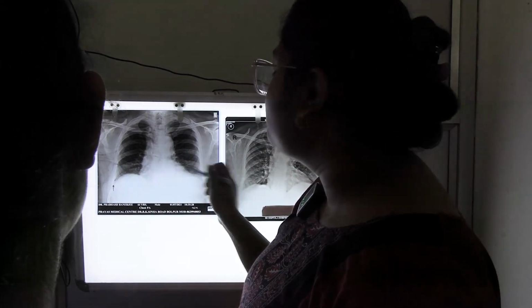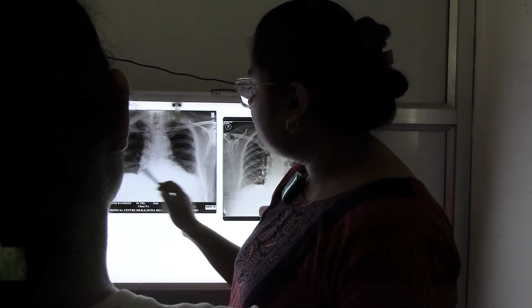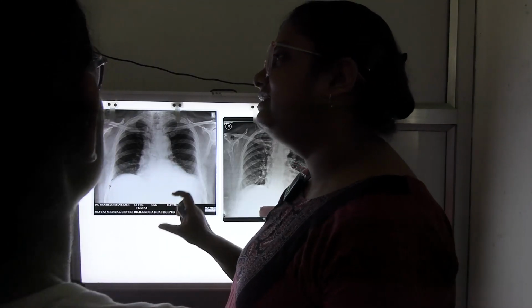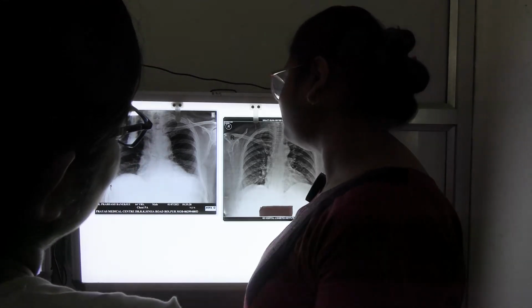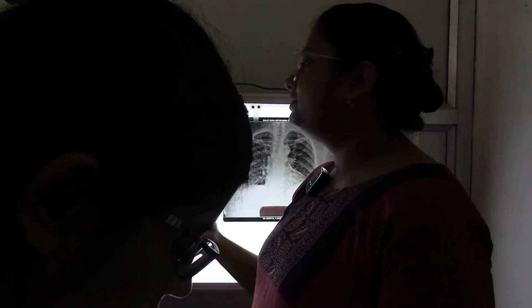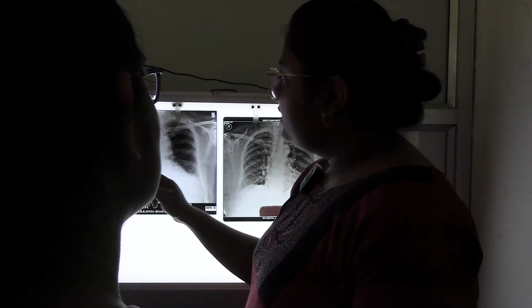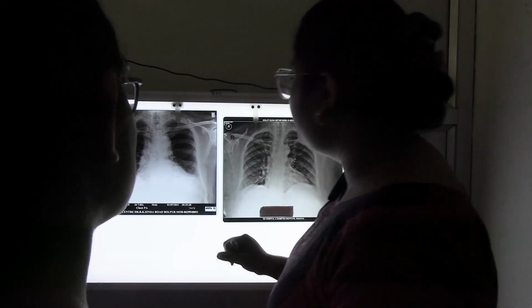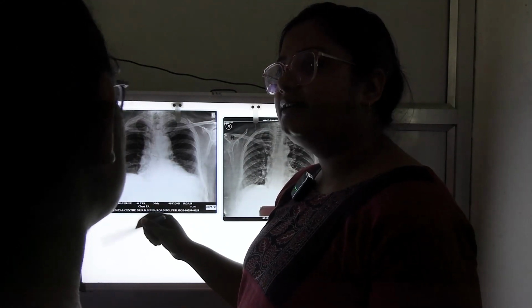So, if fluid accumulation occurs, generally in this costophrenic angle, and it will obliterate the angle, then it is called the pleural effusion. Okay. And it can occur due to hydrothorax, pyothorax. Mainly in these cases it will be obliterated. Okay. And in pneumothorax there will be widening of the angle.